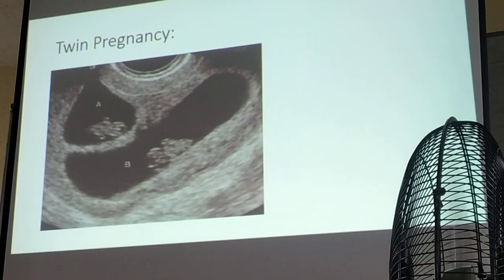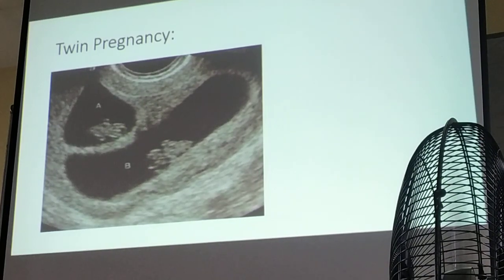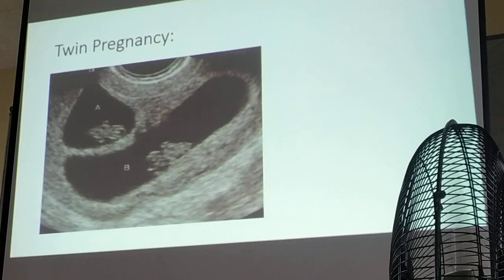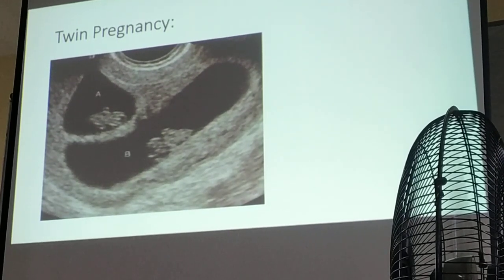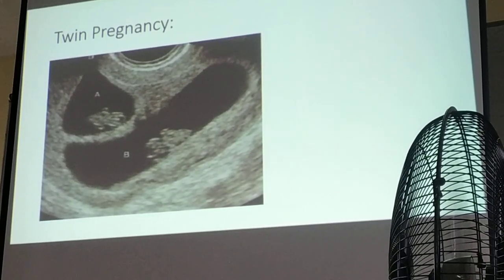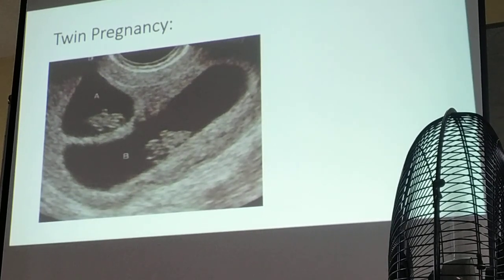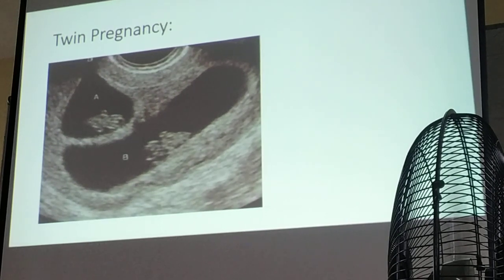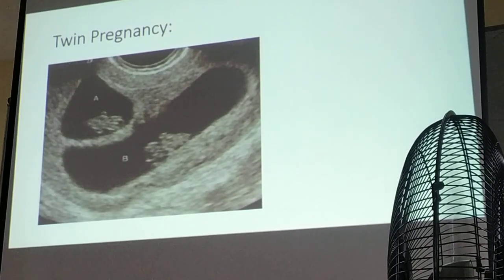This one, if I'm going to ask you, what's this? This is twin pregnancy, but don't expect I'm going to show you twin pregnancy. So your answer there would be multiple pregnancy. If it's more than two, okay? So I can show you 3 or 4 embryo. So you just count the embryo, then just write multiple, okay? This could also be a multiple pregnancy. It's more than one. Okay?